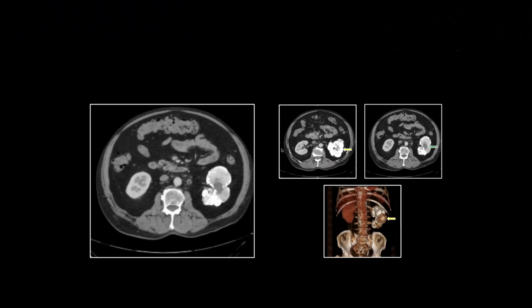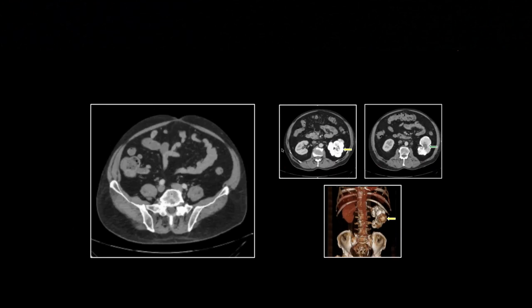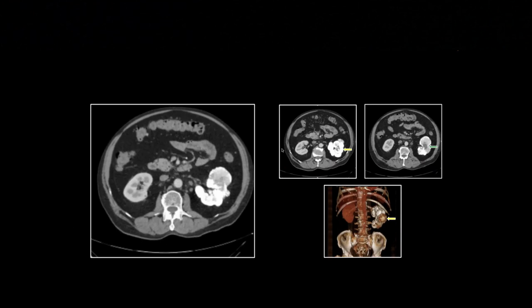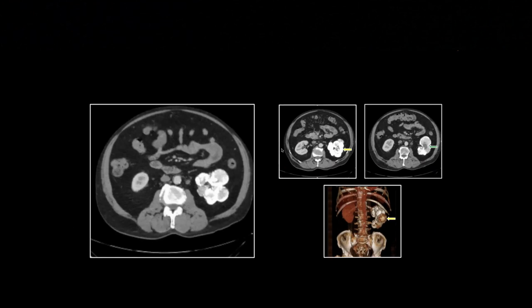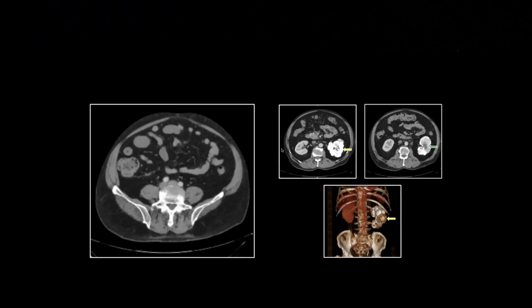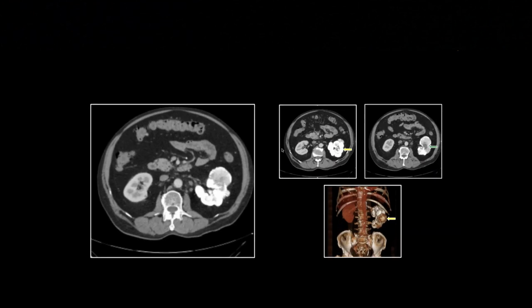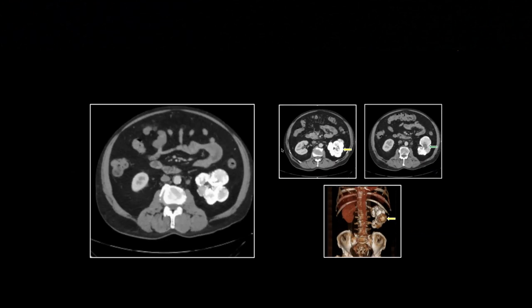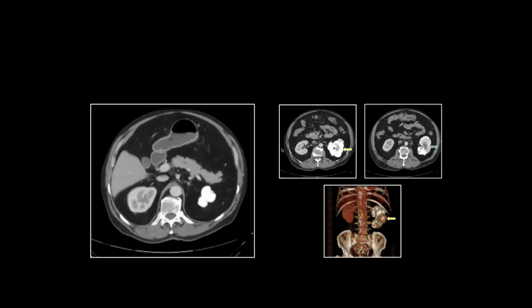So the end stage of renal tuberculosis is a phenomenon known as putty kidney, where the kidney just becomes a macerated ball of goop. And this isn't quite that, obviously, because so much of it is calcified, but I think this is pretty close to a putty kidney. That's probably a reference to that sludge we're looking at there, that hypodense region centrally.